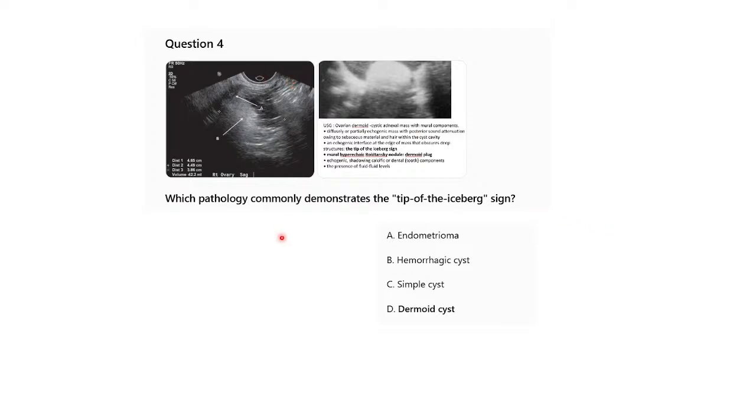Question number 4. Which pathology commonly described demonstrates the tip of the iceberg sign? So we have the lesion that we have there. So which is this pathology?